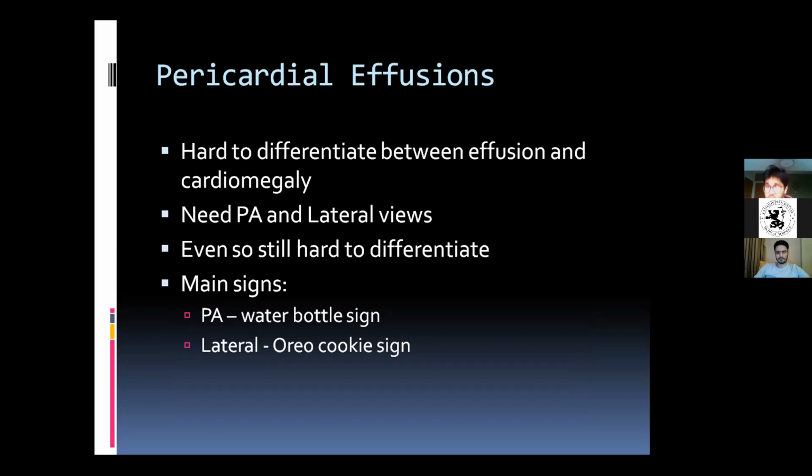I am going to show you the Oreo cookie sign, okay? But before I show you, I want you to have a look at it and try and tell me next week.